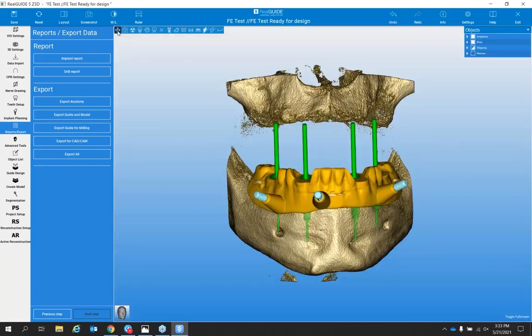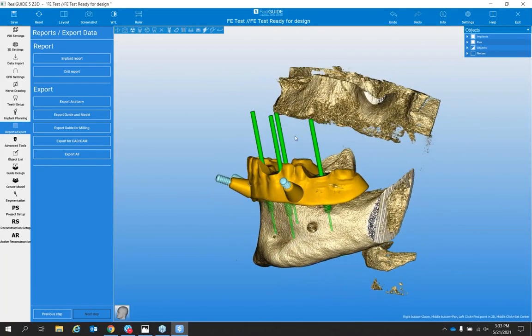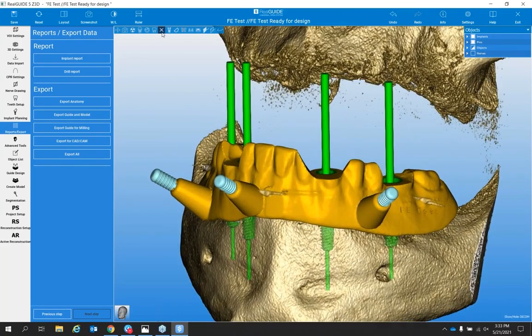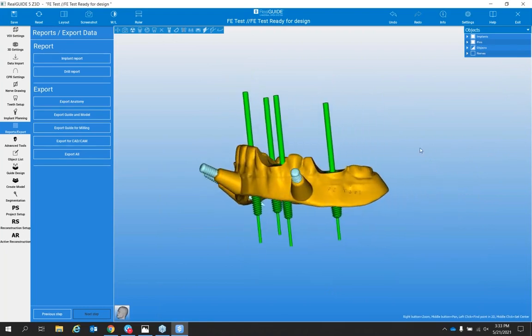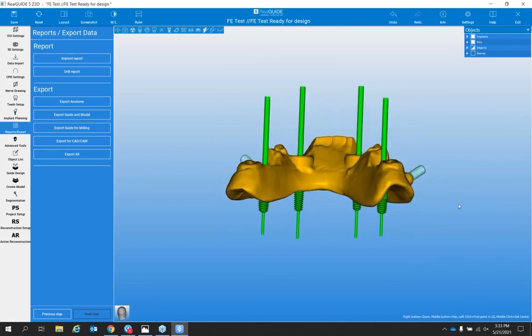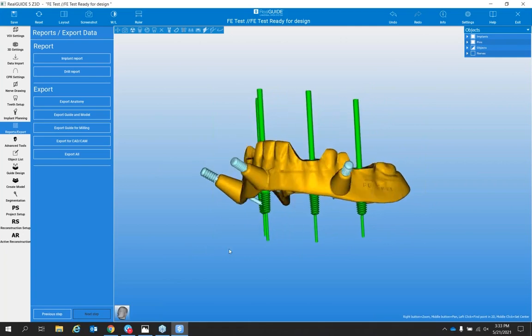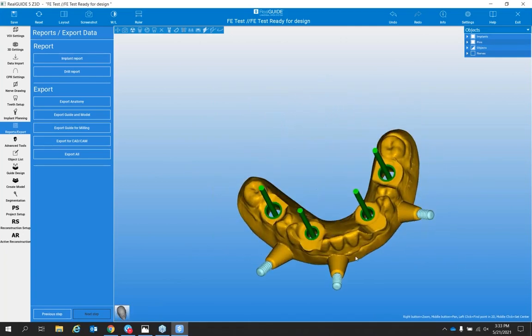So again, I'm going to full screen our 3D view here, and we can see our surgical guide is designed. I'm going to turn off our X-ray, our CT scan, turn off the rest of our 3D image. Get a good look all around. Nice clearance there. Looks good. And again, if we left click on our denture surgical guide, we can change the color.